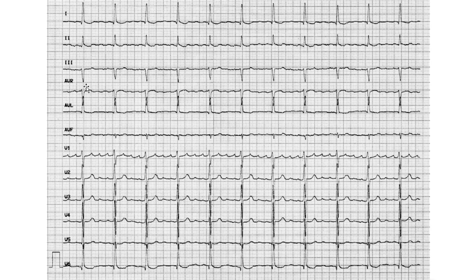The third point, that's the fourth point. We describe these F waves, and we can take their peaks. We measure them. 1,500 divided by 1, 2, 3, 4, 5, 6 roughly. About 5 or 6, I would say. About maybe 5. It's a bit difficult to say.